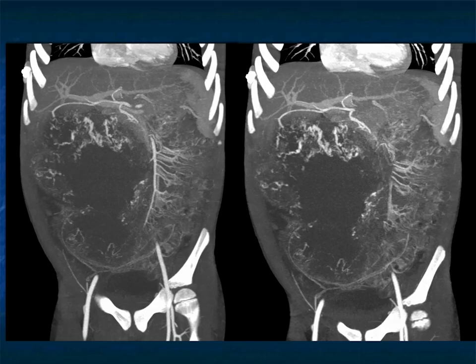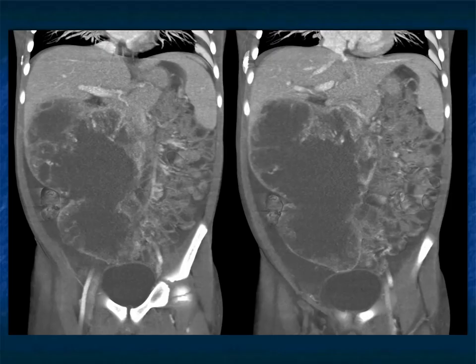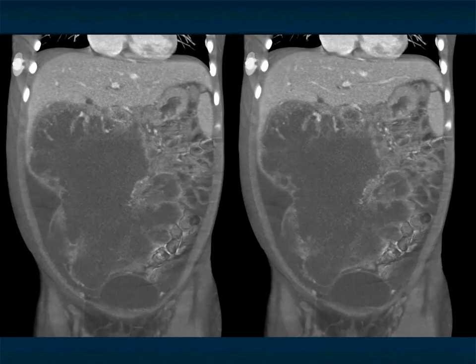Could this be a hepatoma? Look at the neovascularity present. The neovascularity is not something with biliary cystadenomas or cyst adenocarcinomas to this degree. It could be hepatoma. It could be because the patient's young, hepatoblastoma. Those are often very vascular, and that would be a good possibility.